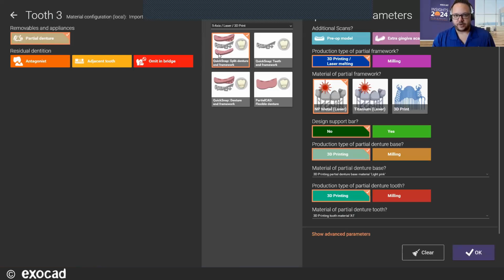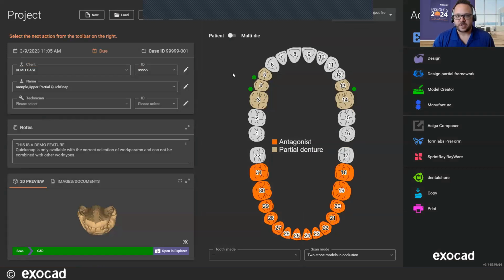Essentially, you can see in this little thumbnail icon that there are positive nubs on that bottom gingiva and top gingiva. So those go into the retention mesh, and same with the teeth. So it all snaps together. So we'll go over that process here, and hope you guys enjoy it. We've got some really good feedback from beta testers, and people have been using it within their laboratories as well.